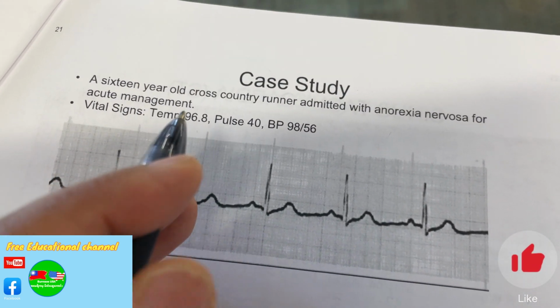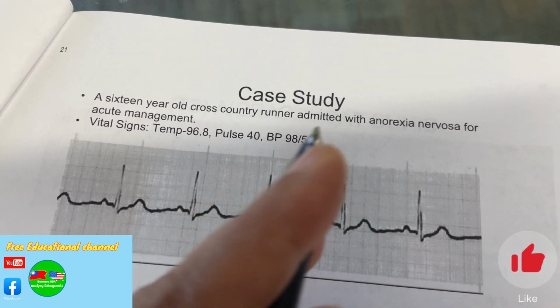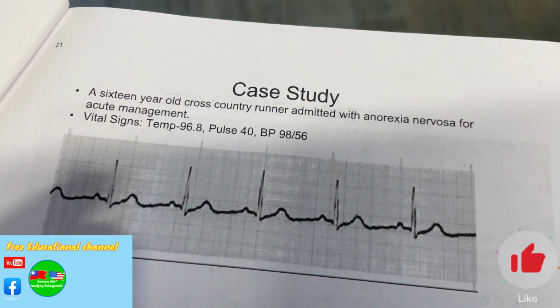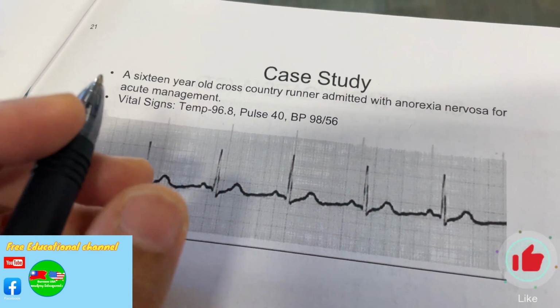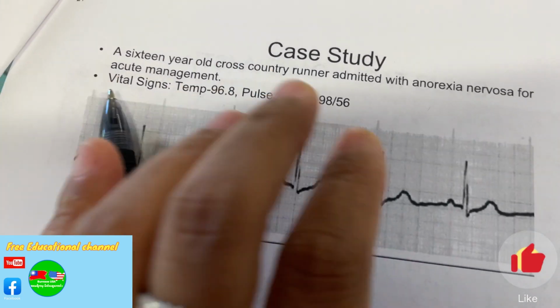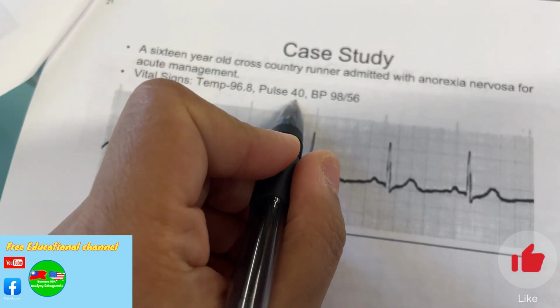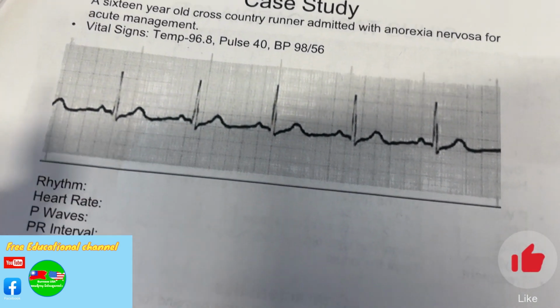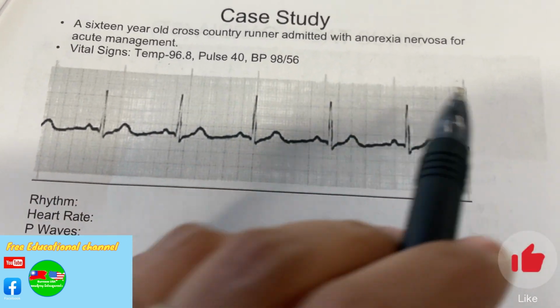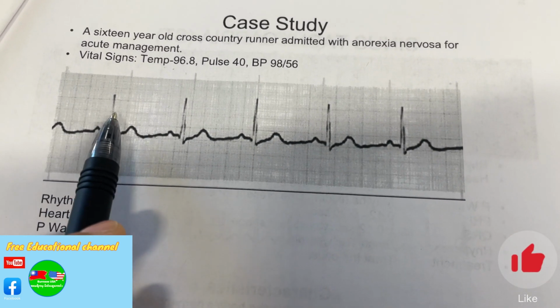Blood pressure comes up and up, higher and higher by age. The older we get, the higher the blood pressure is going to be, but it shouldn't be higher than 140 over 90, whichever age you are. So this is okay, this is okay, this is not okay. It is kind of bradycardia. Look at this 6-second strip, 1, 2, 3, 4, 5, 6. The rates are regular. And what about the rate?